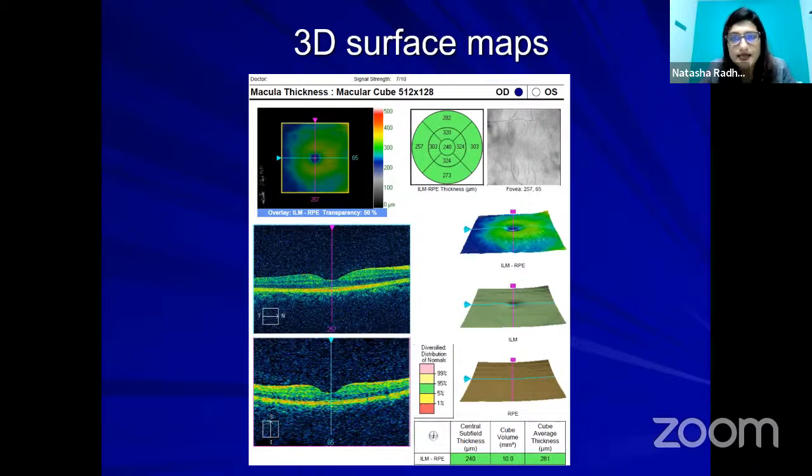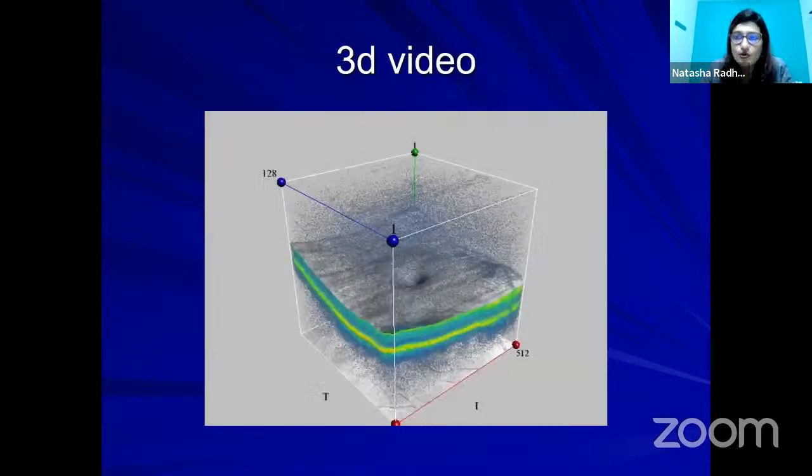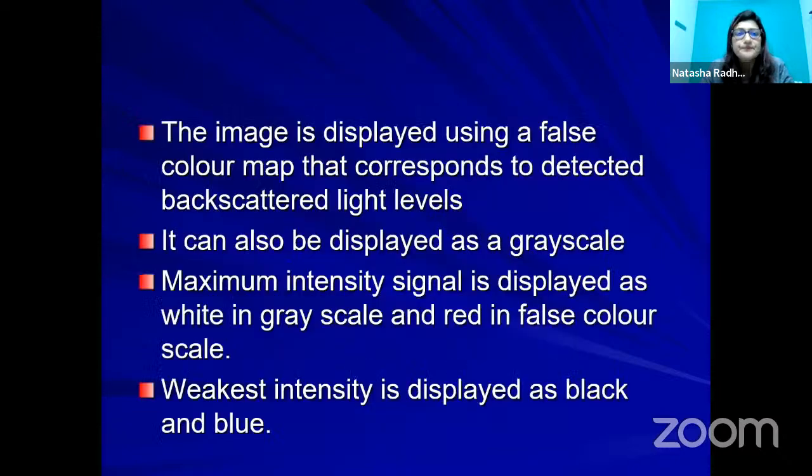3D surface maps can be done; the machine itself will provide the 3D surface maps to you. Once you have done that, you can also have your result as a 3D video, which is of more use when you are going to demonstrate it to a patient.